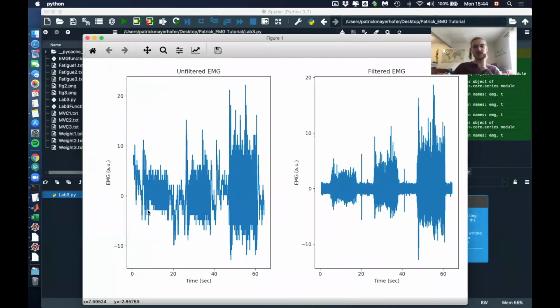So now you can actually see that really, really well. On the one hand, we have taken out all the frequencies that are under 20 hertz, which is the slow frequency swinging here, which might be from the cables, it might be from some movements or whatever. So now here it's very beautifully straight, so we don't have very low frequencies anymore.